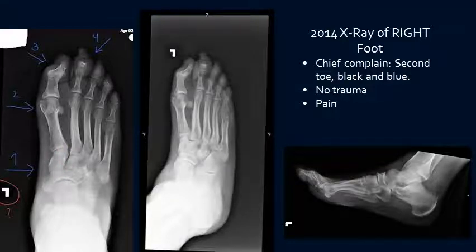a presence of hallux valgus deformity, and we can see it on this side coming out. A flexion deformity of the DIP joint at the first digit, this one, and a flexion deformity of the DIP joint at the second digit with soft tissue swelling of the second digit that we can see all around here. The doctor couldn't exclude fracture this time because of the way the distal phalanx projected over the middle phalanx of the second digit, but a follow-up study was recommended.